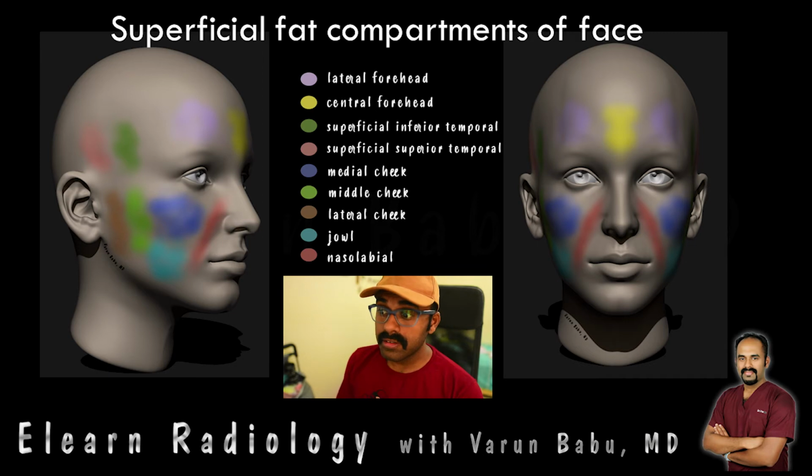And there is the lateral cheek compartment, which is further lateral to the middle cheek compartment and stops in front of the auricle or the tragus of the ear. The jowl compartment is seen inferior to the medial cheek compartment, and it extends inferiorly up to the margin of the mandible.